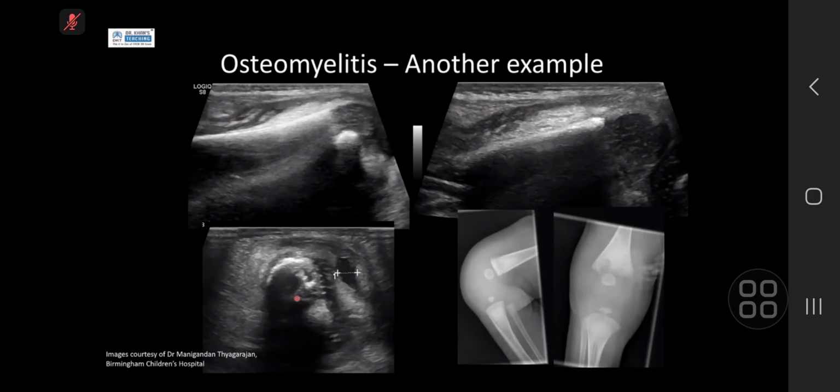You can see it's quite florid, and it should be nice and smooth, not looking very edematous. Looking at the soft tissues, the bones here look quite craggy. So that's the axial or TS view. You've got a little fluid collection here, which could represent a soft tissue collection, and there's some erosions going on here. For erosions, you need 2 planes. Unfortunately, I don't have 2 planes here. I've got one plane in the TS, and you should have another one in LS to confirm that it's an erosion. But then we look at it on the X-ray that was done, and in peds, we often like to have different modalities to correlate what we are seeing. We get better that way. And you can see that that's a very ill-defined distal femoral metaphysis showing these bony erosions of infection.